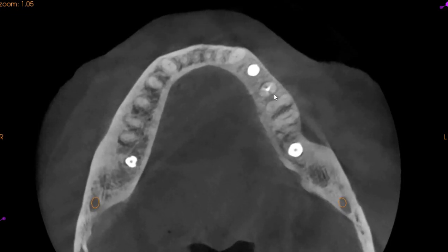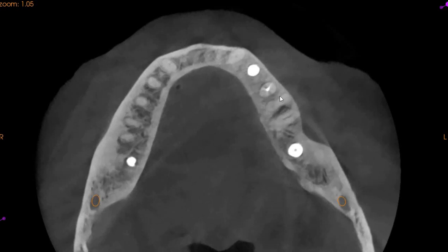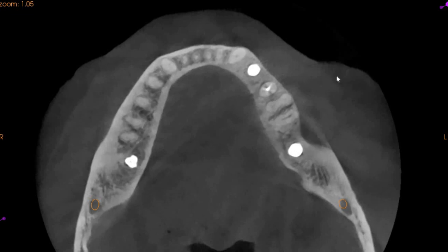In fact, we do see a little bit of thinning here, but that is cortical plate, the cancellous bone as well. So our conclusion is that we don't see a very conclusive evidence regarding the presence of a fracture. This is down to 150 micrometers.